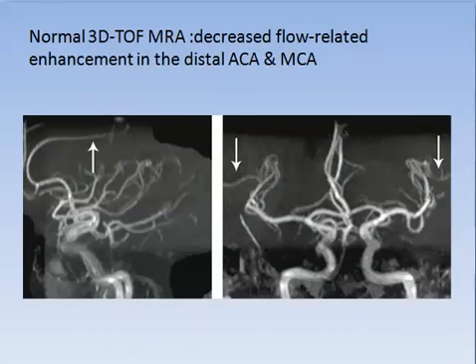Here we have the normal 3D, decreased flow related enhancement in the distal. As you are going distally, you will find decreased enhancement. This is 3D time of flight. There is no contrast given.